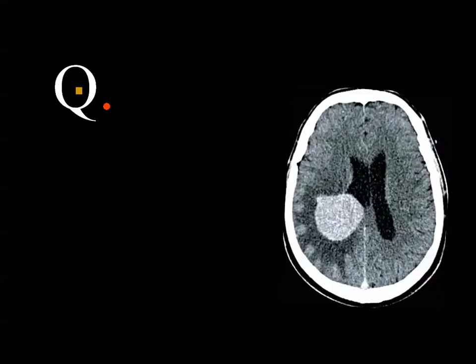What is this exam? This is an axial CT scan of the brain, soft tissue window, after injection of contrast material showing an intraventricular homogeneously enhancing mass in the atrium or the trigone of the right lateral ventricle. Yes, this patient looks an adult. Yes, the most common homogeneously enhancing intraventricular tumor in the atrium is the meningioma.